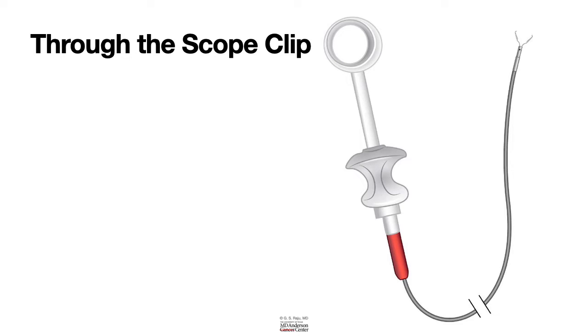Nowadays there are several different companies that manufacture through the scope clip devices, and it's important to learn how to operate each of the clips. For the most part, they have a similar function and similar mechanism of action with minor differences. So let us learn about the various applications of through the scope clips.